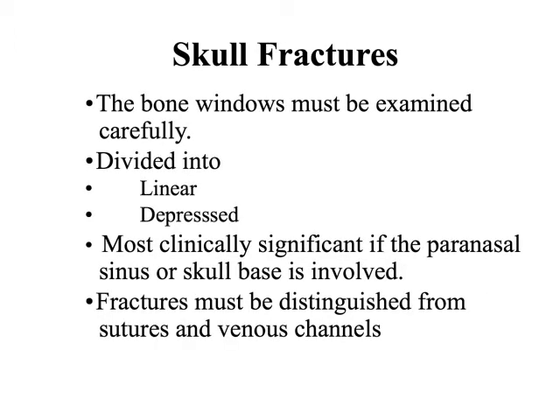So, typically when we do a routine head CT, we're looking at both soft tissue and bone windows. We're using the bone windows primarily to evaluate for fracture. There can be linear fractures where the bones kind of match, and then depressed fractures, like from blunt trauma or a blow to the skull.